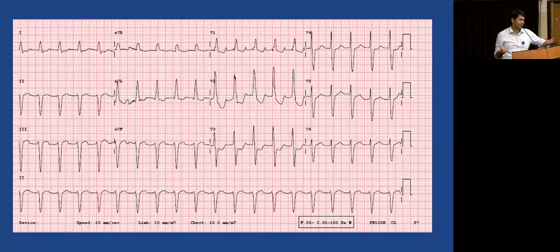We call this a named rule, the BIX rule. When you have a mid RP tachycardia, always suspect that there is a P wave within the QRS. It's an eponymous name. Look for another P wave buried within the QRS. Usually, if you carefully look at all the QRSs, you may find it. For example, here in V1, the initial part is sort of slurred, and if you use calipers and march them out, it in fact marches. So what you may pass off as a 1:1 tachycardia is actually a 2:1 tachycardia. So this is actually atrial flutter with 2:1.